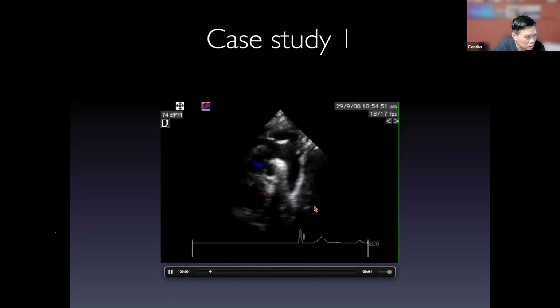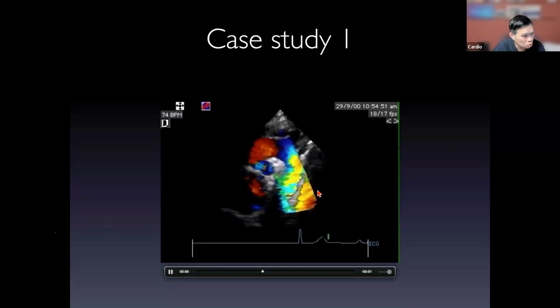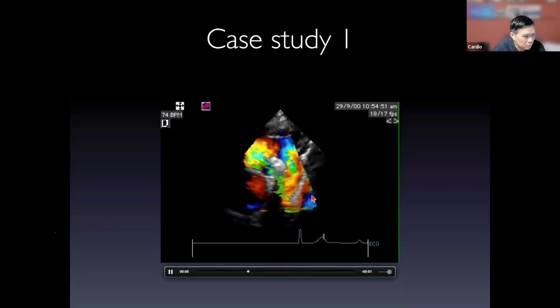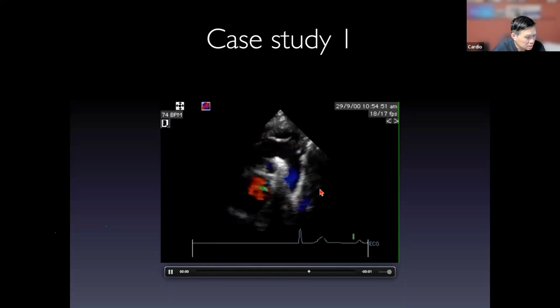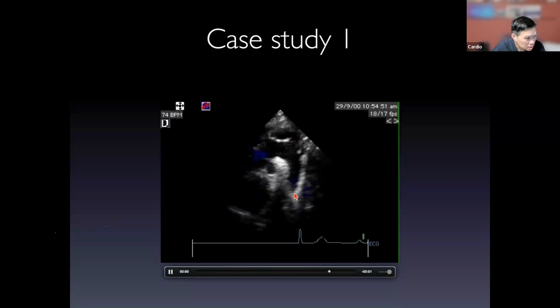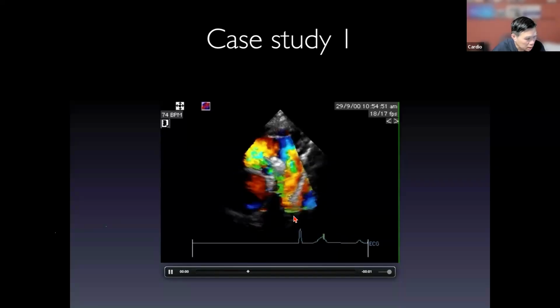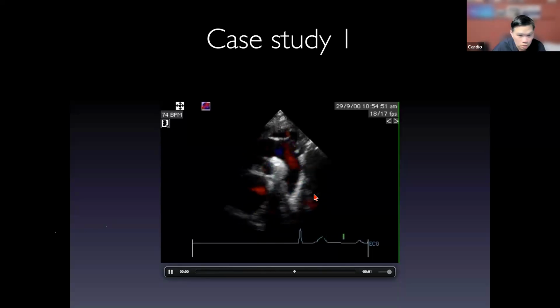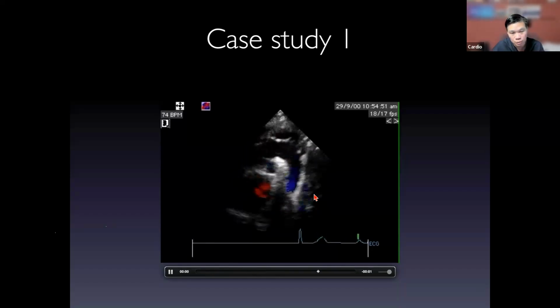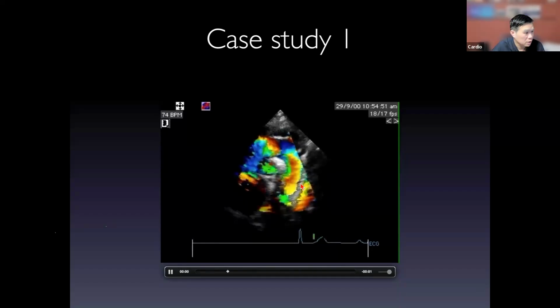Because it is outside, we know human beings do not have two aortas going side by side going down, right? Unlike Klingons, for example, because Klingons have multiple hearts in Star Trek. That's only for people who are Star Trek fans. But here you have a color Doppler going forward and another color Doppler going forward. You probably see it. Now that I pointed it out, for the rest of the day, go and look for it. You probably will see it in about 40 to 50% of all your cases.